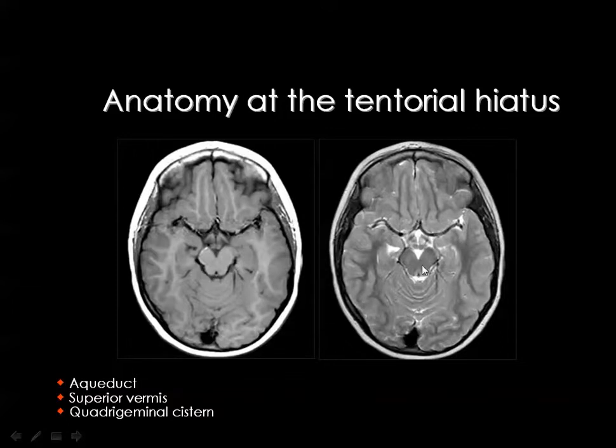And then you know that this is known as the cerebral peduncle, and we have only one cerebral peduncle on each side: this is the cerebral peduncle on the left, and this is the cerebral peduncle on the right. And this CSF space is known as the interpeduncular cistern. And in this interpeduncular cistern, important structures will be mentioned immediately now.